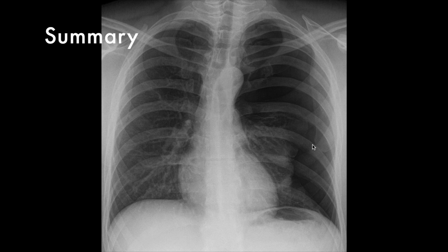In summary, this is a plain chest radiograph of an anonymised patient with clear signs of a left-sided pneumothorax.